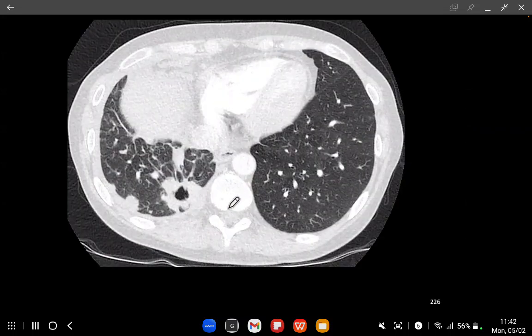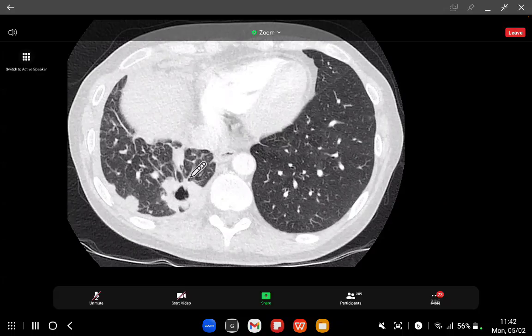Okay, this patient has got a pleural-based tumour. There's a cavitary lung tumour. There's volume loss in the right hemithorax. And what else is there in that lung? Lymphangitis. That's right, lymphangitis. All these thickened septal lines. Lymphangitis carcinomatosa.